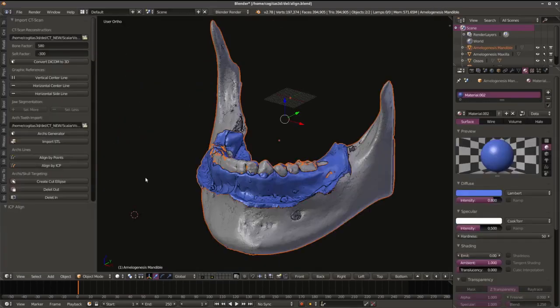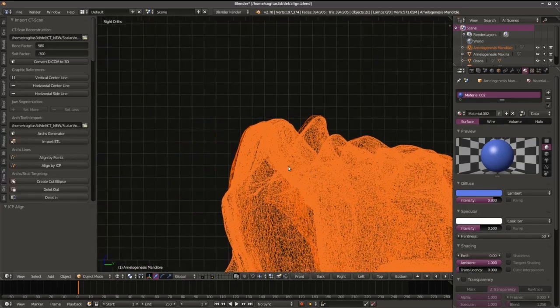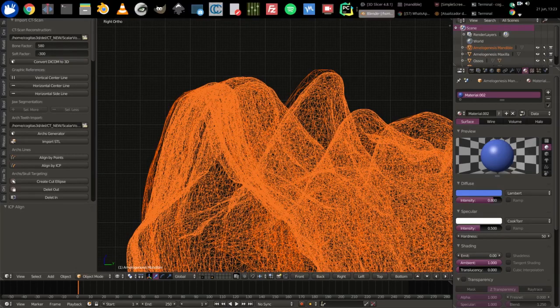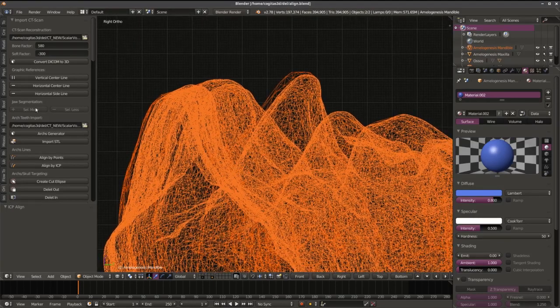Now I click enter and it will be aligned, and I will do what we did before, but I will only show the recorded result because it's fast. And align by ICP, we have to wait a little, and we can see more or less in this part.